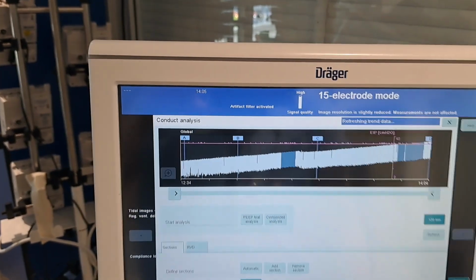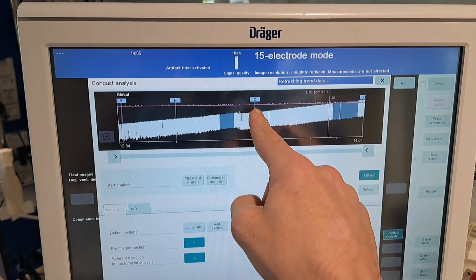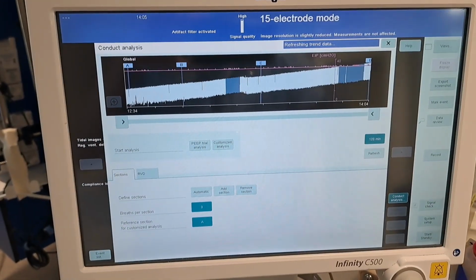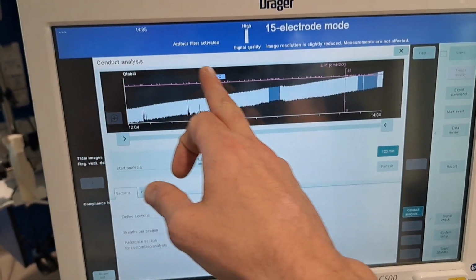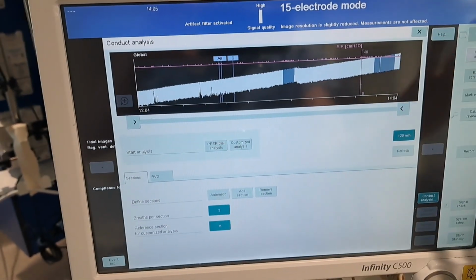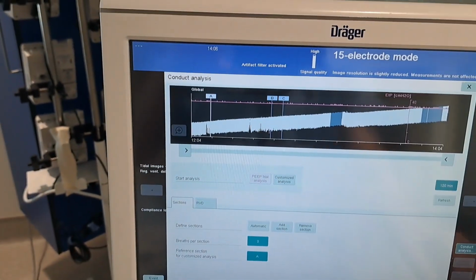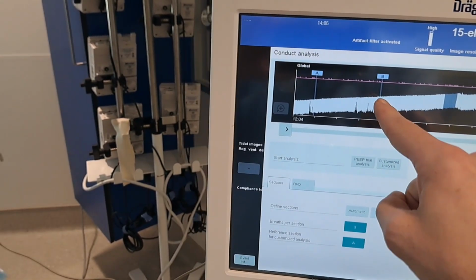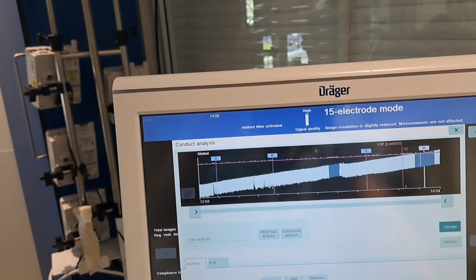Let's put this over an hour and a half. These are trends. You can refresh. You can put these regions of interest. You can add, you can remove, you can put it wherever you want. So yeah, it's been 4 hours. This pink line, that's the P-high level, and you've noticed that it hasn't changed at all. But prior, I was able to compare all the varying changes.